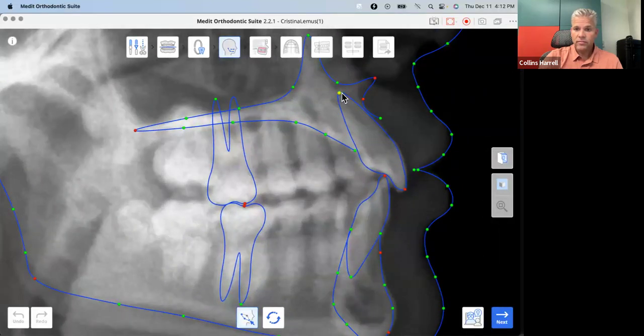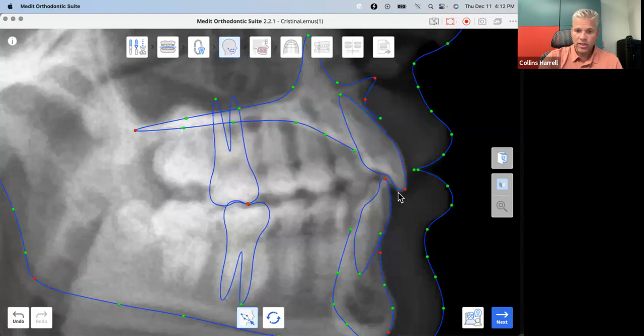And that looks good. I don't know if you adjusted that already, but it looks good. I like the incisor position. A point looks good. B point looks good. I might move that up a little bit just to get that occlusal plane. It's always hard to tell which molar is going to be the one you can see in the model, but let's go with that right there.